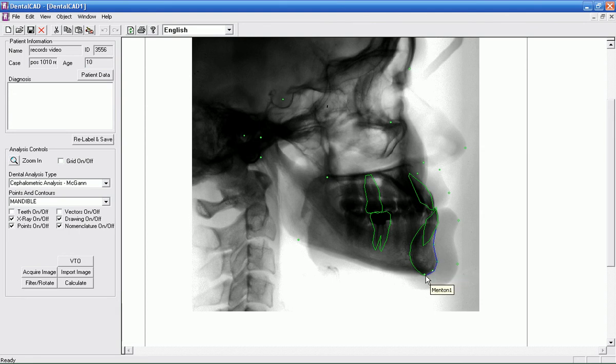Now, I started the mandible, and it's a series of points. And it's basically in between a couple of curves here. Okay, and so wherever the mandible starts to curve again, well, that's where the points would be. There's nothing really measured off of any of these. So it's not so important. I wouldn't stress over it very much, but you just want to make it look nice. And it might be nice sometime for an overlay. That's when you're trying to see where everything moved.